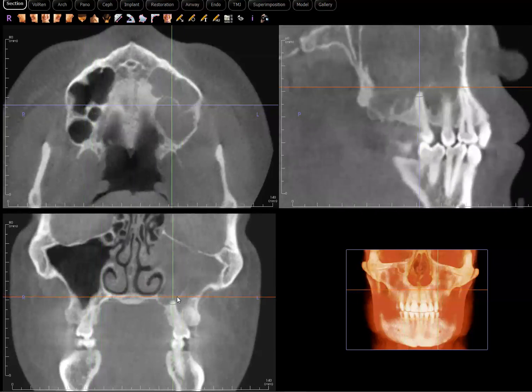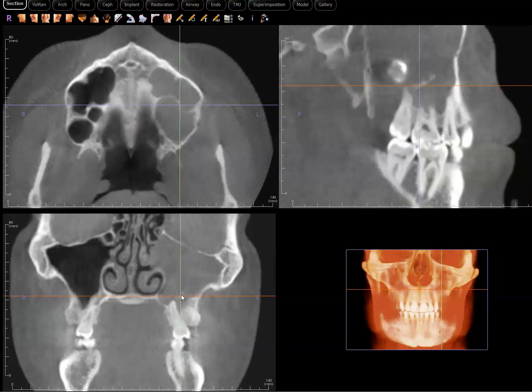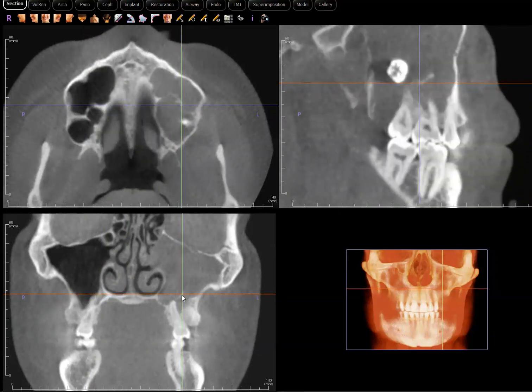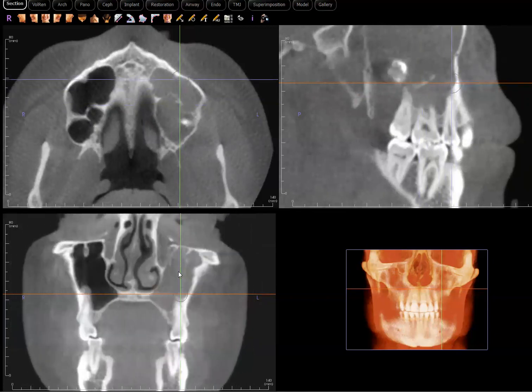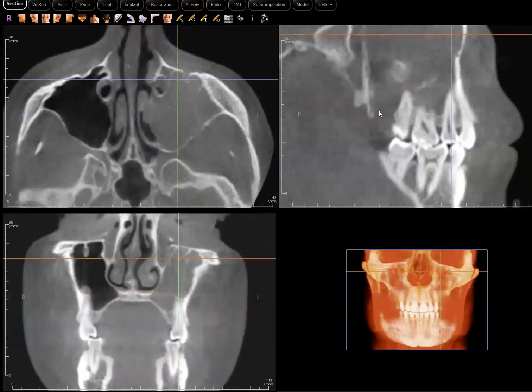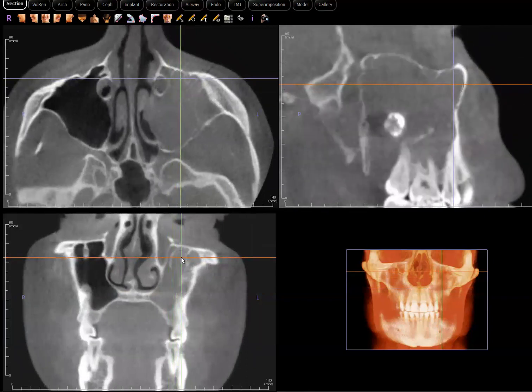And knowing how often most patients have some degree of calcification, mucositis and dystrophic calcifications within the sinus, there may have been some pre-existing calcification on the floor, and that may be what we're seeing here. But anyway, the major takeaway point that I want you to see is an example of odontogenic keratocyst extending into the maxillary sinus.